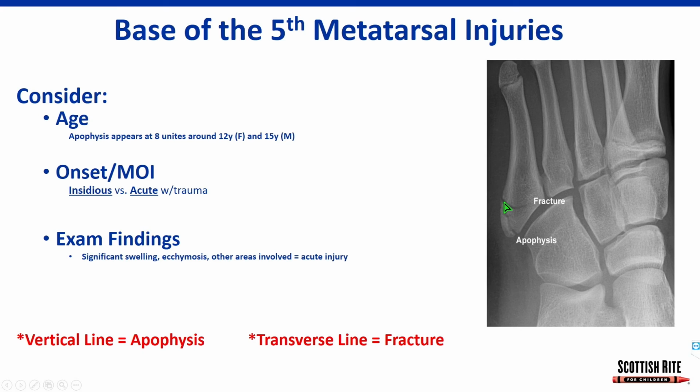Sometimes the x-ray for a young skeletally immature patient with this apophysis can look very similar to that of a fracture and an avulsion injury in that area, and we'll cover that here in just a minute.